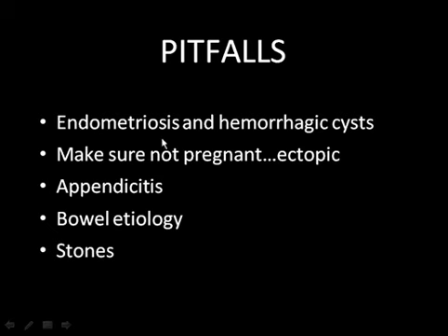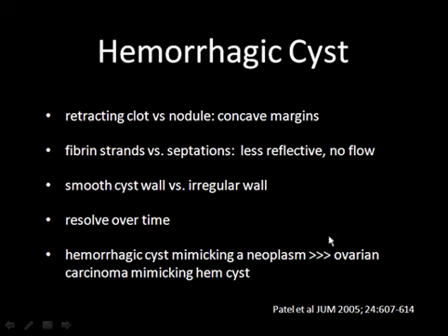Now, there are some pitfalls because endometriosis and hemorrhagic cysts may also cause acute pelvic pain and present with a similar or overlapping appearance. It is important to make sure that the patient is not pregnant, as ectopic pregnancy would be included in that differential diagnosis. It's also important not to forget that non-gynecologic causes can also cause pelvic pain. Hemorrhagic cysts have many appearances and may be difficult to distinguish from other ovarian pathology.